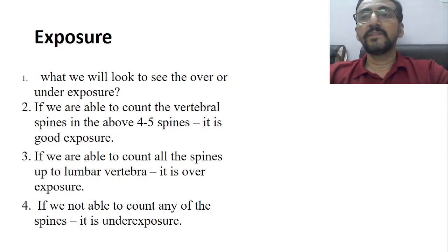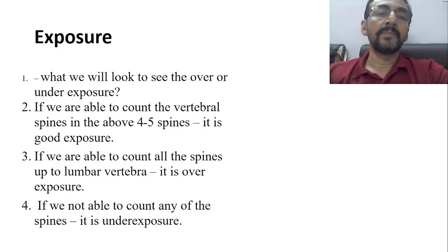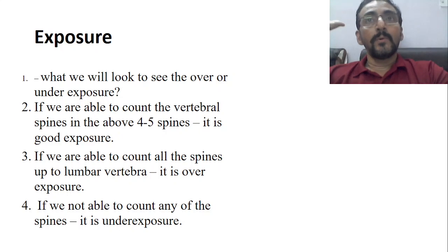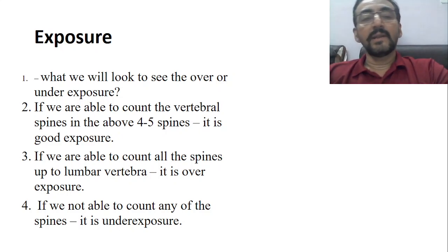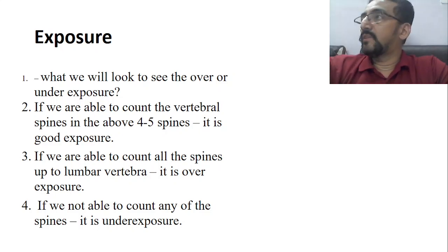So when the technician tells the child to take a deep breath, the child may go for expiration also. So it's not only the technical part, there is a cooperation part as well. Now, whenever you get an X-ray, what you have to see is either overexposure or underexposure. Both are very important, over and under exposure.